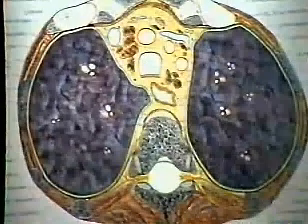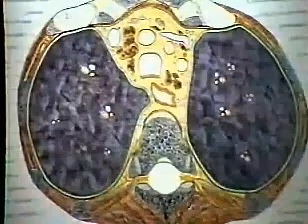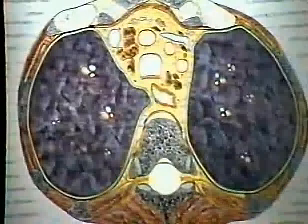The artist, as you see, has drawn in a number of lymph nodes. These are larger, particularly these, than they would be in a perfectly normal person, but the location that these lymph nodes may be found is accurately portrayed in this diagram. What does a CT scan look like?